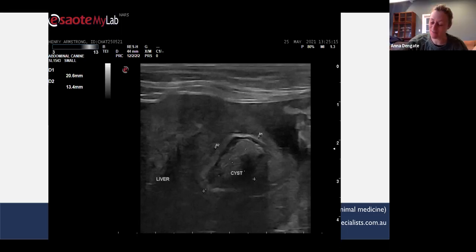So Jill, I think you raised some really interesting points. I threw you guys a curveball by writing cyst in this structure. In theory, that's correct because it's got fluid in it and it's a thick-walled, fluid-filled structure. But a degenerative cyst is not high on my list of differentials for this, given how echogenic or mixed in echogenicity the material inside that cystic structure is. So I agree with you, Jill, that abscess or neoplasia with a necrotic center or an organizing hematoma would be the highest things on my list for this lesion.